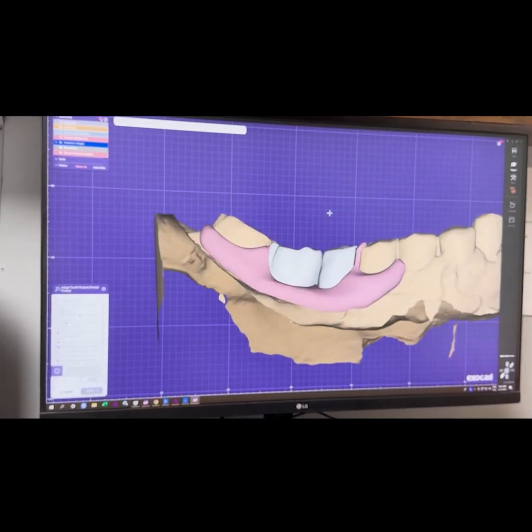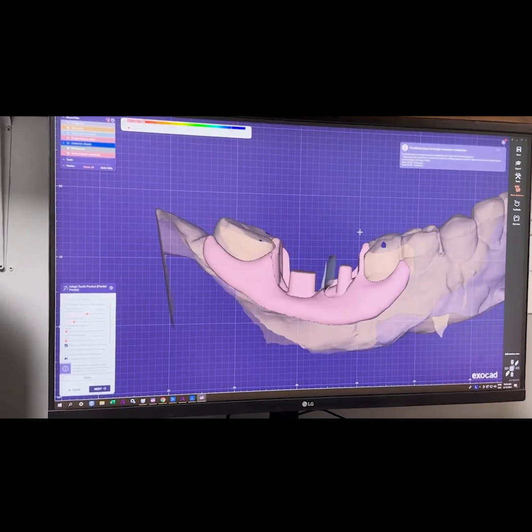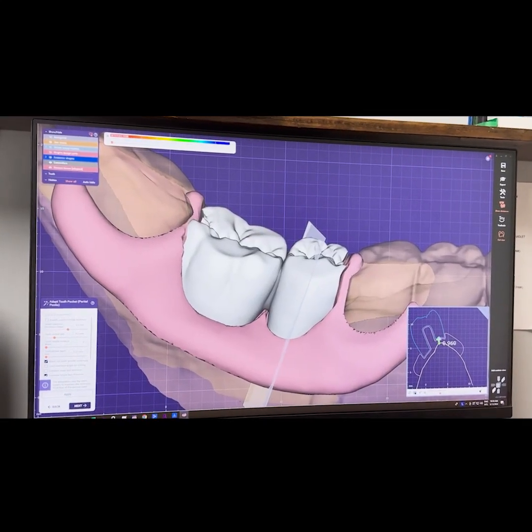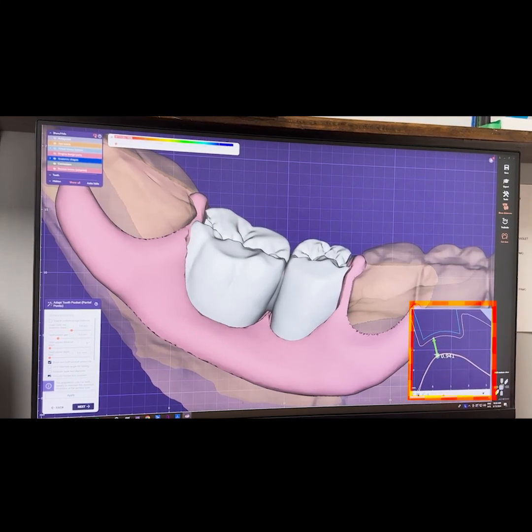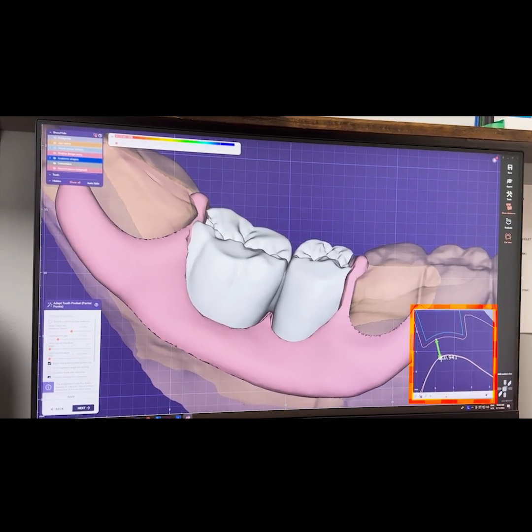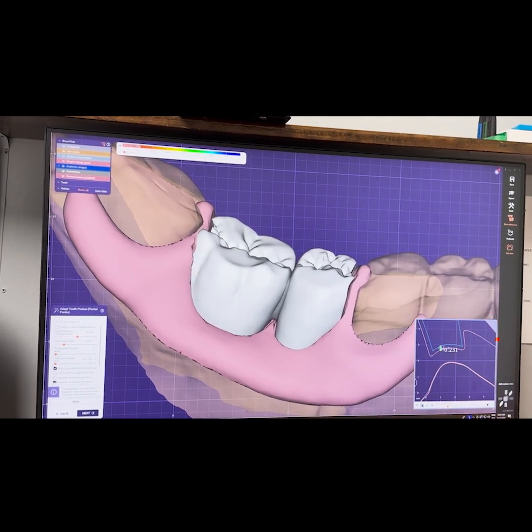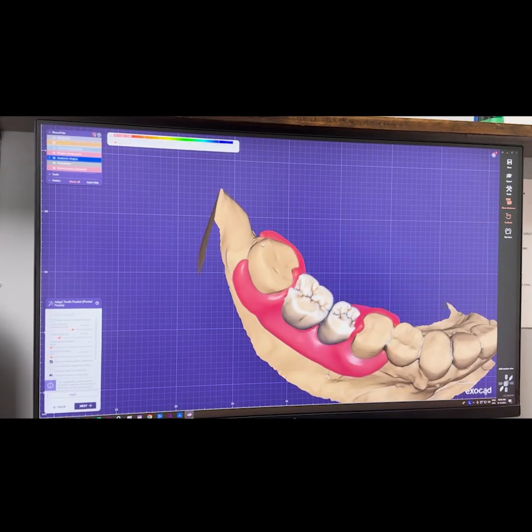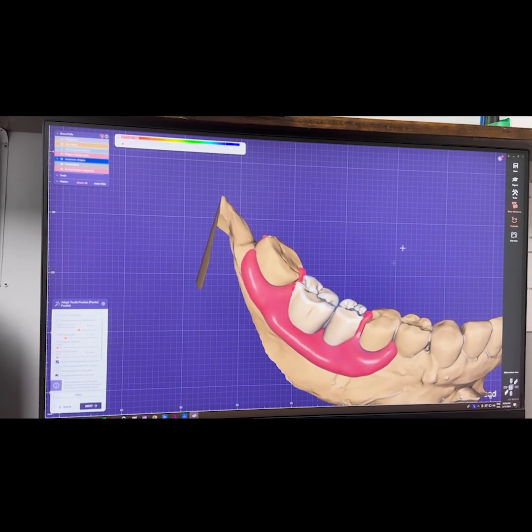At this stage, you can view the version without teeth, noting the 0.8 mm as the maximum thickness and the minimum of 0.2 mm gap. That is the final step before milling. For demo purposes, we did not get too much into detail to make it perfect. Once you are ready, save the file.